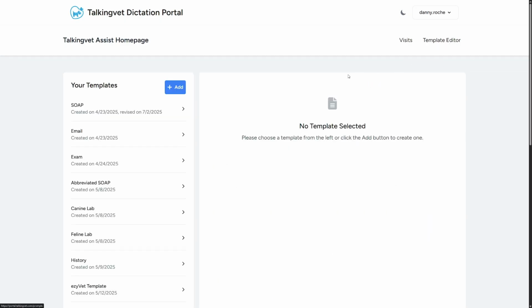So real quick, I'll show you my template. As you can see, my list of templates are over here. You can either make yours from scratch with our visual template builder, or we have a library of templates that you could pick and choose from and then make your tweaks. So for example, if we already have an ultrasound report that's pretty close to the one you use, you simply choose that, and make your personal preferences and changes from there.